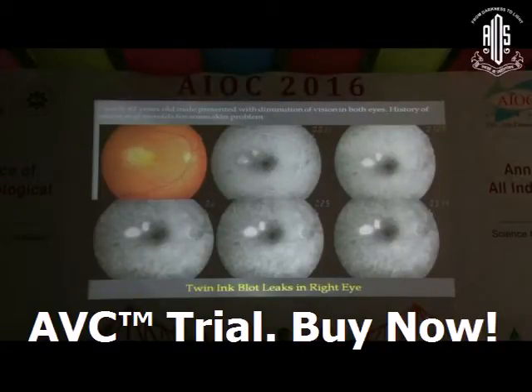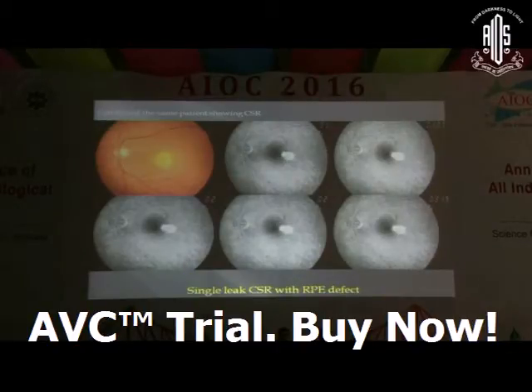Case 8 is a 42-year-old male presented with diminution of vision in both eyes. The patient had some skin problem for which he was given some treatment. It was probably oral steroids for the skin problem. So this is the right eye of the patient. There are 2 leaks and a PED in this eye. The other eye of the patient is also showing CSR with a leakage. So bilateral CSR is usually common in patients on steroids.